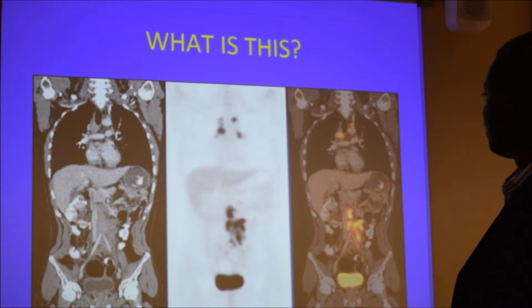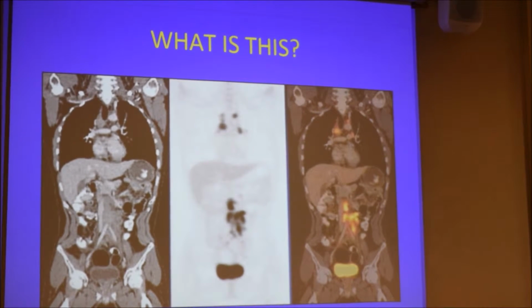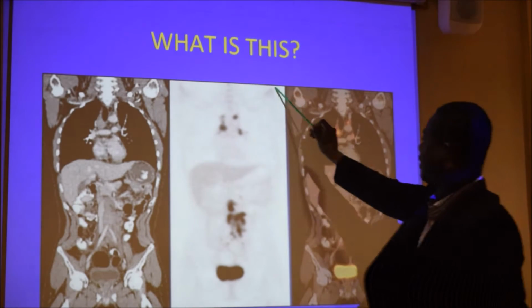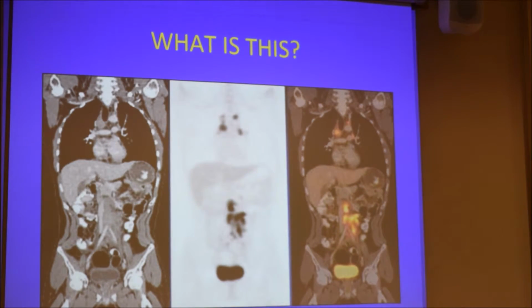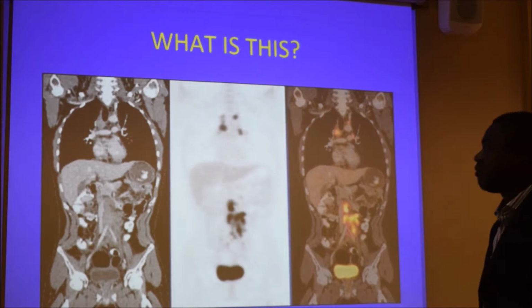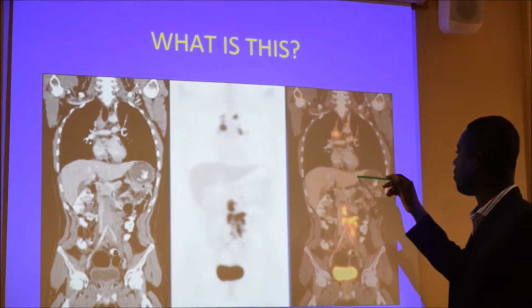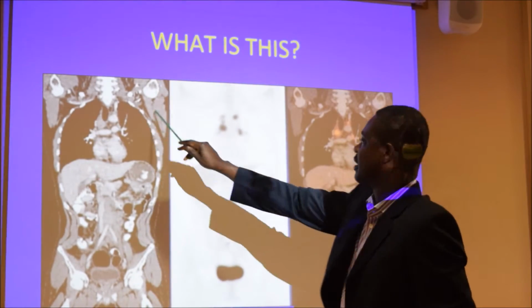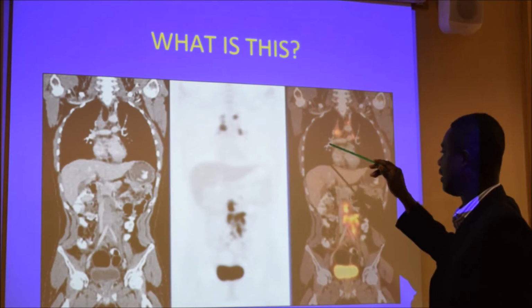Now what is this? Okay, this is a PET scan. This is actually the PET image. And now we're doing hybrid imaging where we're fusing different modalities. So a CT scan is fused with a PET image to give this hybrid image where we've superimposed the images there. So this gives us the anatomical data, that gives us the functional data, the patient with the lymphoma.